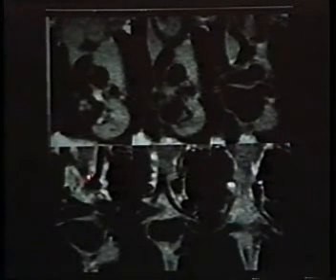Let's take a look here at the MR in this patient. Ascending aorta, origin of the right innominate. Here comes your tracheobronchial tree. Here's your trachea here. Notice that we lose the trachea right here as the innominate passes anterior to it, and now we have beautiful visualization of the right and left main stem bronchus. So there's clearly some compression by the innominate artery in the coronal plane.